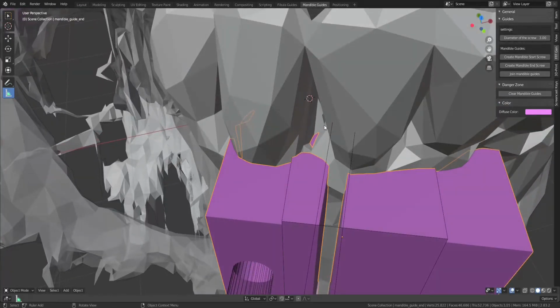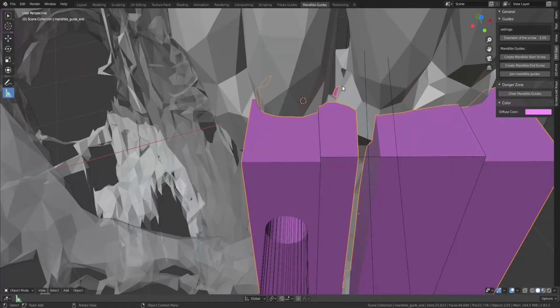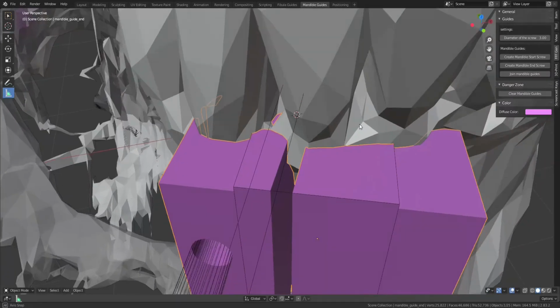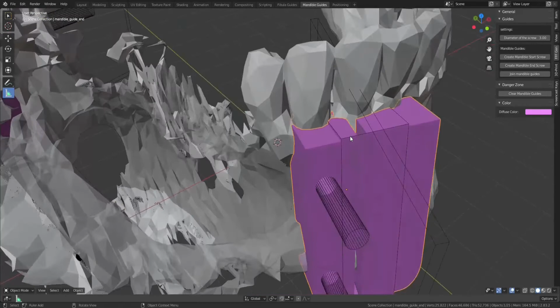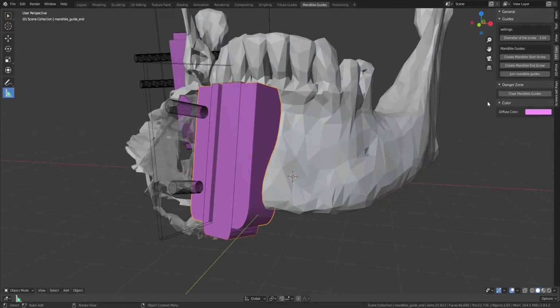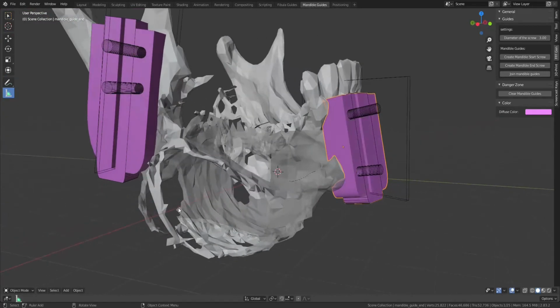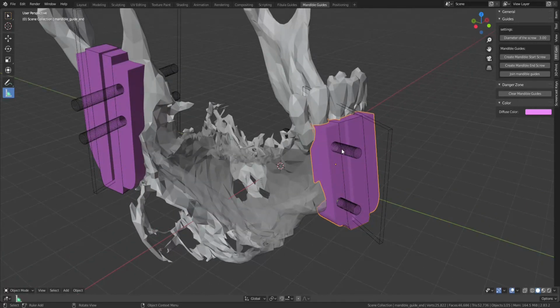Okay, I don't want to have small connected segments that go between the teeth because well, it will be hard to insert the guides between the teeth. So I think this should be it. Obviously, for this case, because of the protruding and expanding tumor, I'm not able to connect these two segments, so I have to save them separately.